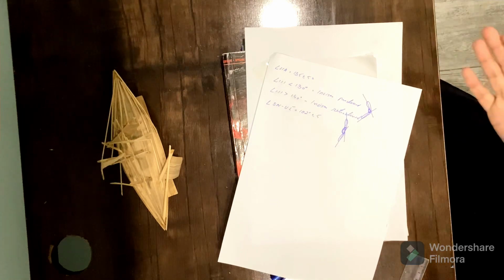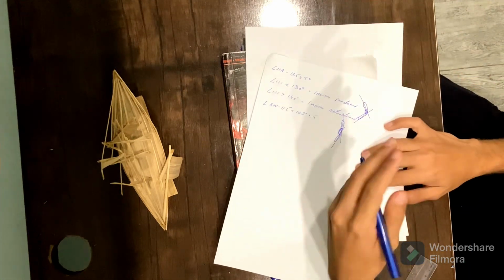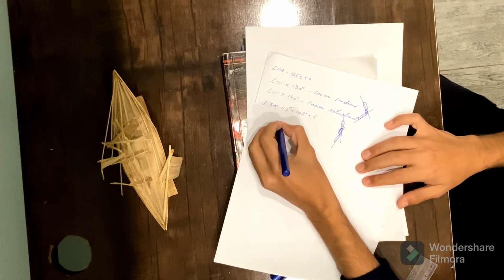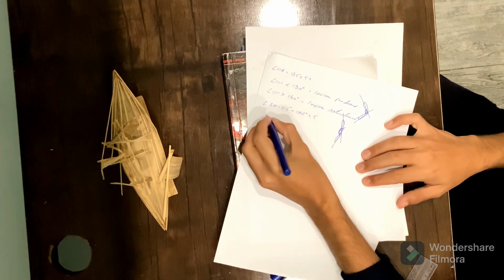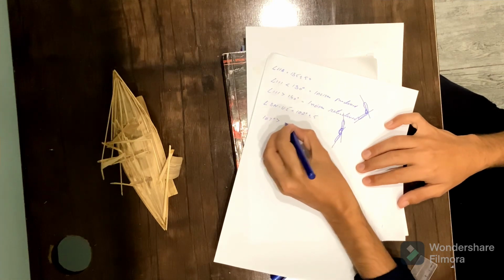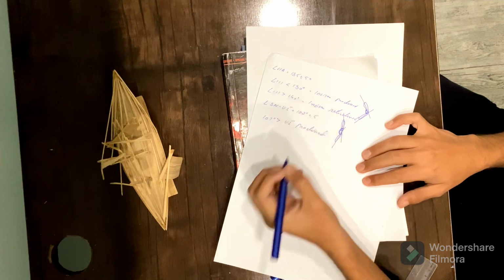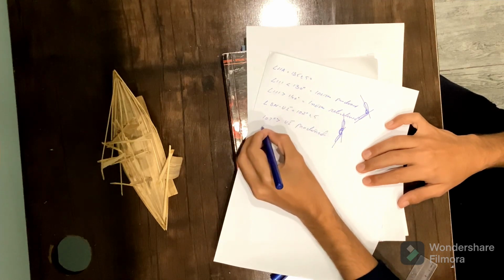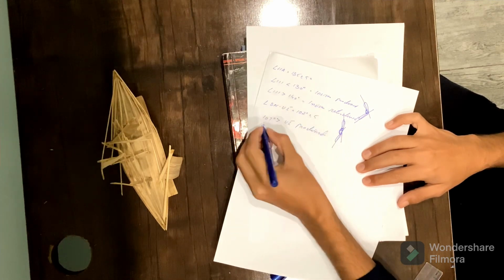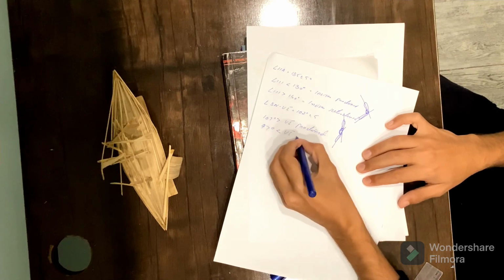It tells us the relationship of the upper incisors with the cranial base. If this value is greater than 107 degrees, the upper incisor is proclined related to the cranial base, and if it is less than 97 degrees, the upper incisors are retroclined.